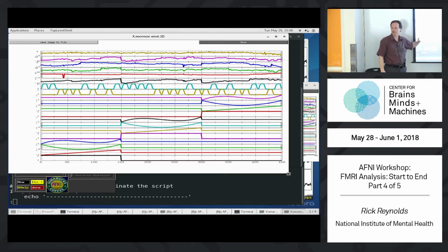And that's not the actual plot. That is the beginnings of the third order polynomial. These are Legendre polynomials. I'm just saying the data doesn't actually look like that. It doesn't need to be detrended that way.